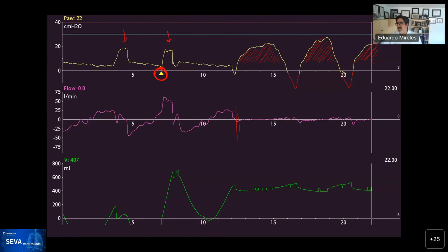I didn't go into another thing that we did with this patient, for another VentRounds, which was using the intelligent algorithm. When I saw this, I said maybe the sensitivity is all wrong and we need this mode. This is the Hamilton, and we said let's use IntelliSync, and that didn't work. But that's for another discussion on technology and how to use it appropriately.